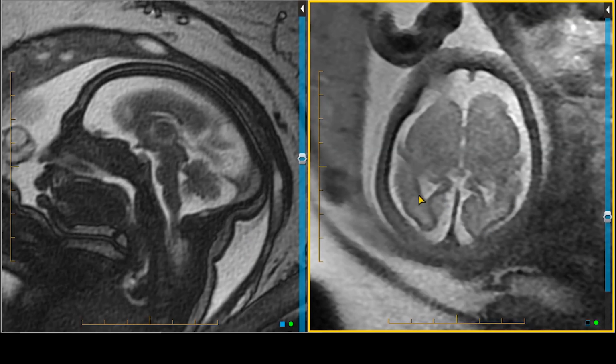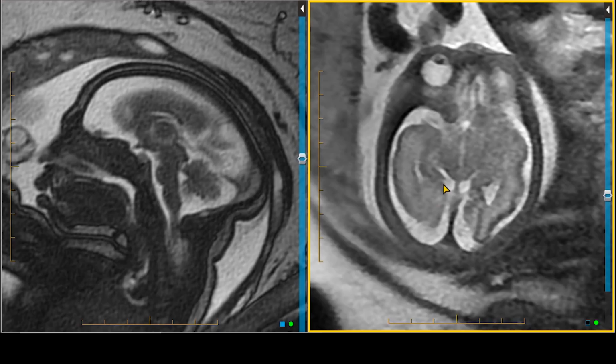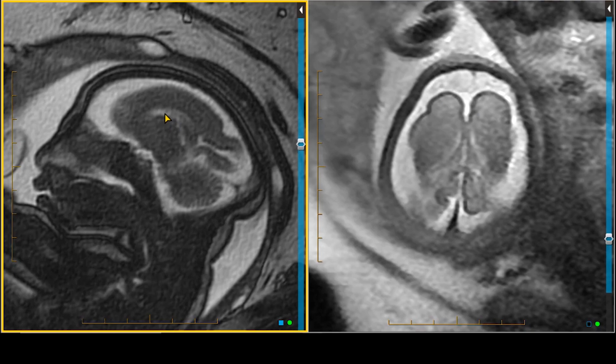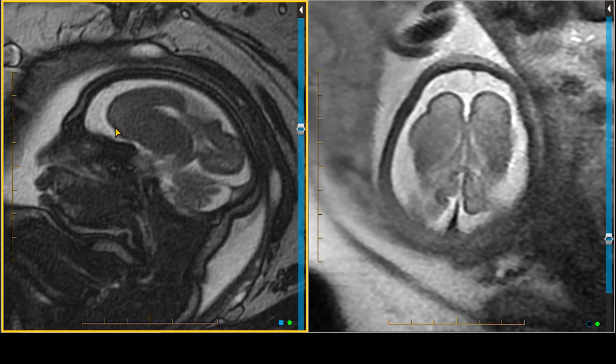It's difficult to see in fine detail in a fetal MRI because of the small size, but you can see there's some sulcation and some different substructures. But if we go to the frontal lobes, in particular the frontal poles, this is very featureless. Same with on the left side. So both sides we're not seeing much. If we go to the sagittal view, we're seeing a very featureless frontal lobe.